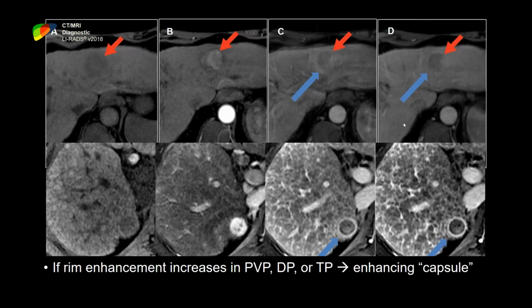Ultrasound would not be detecting the corona, so most likely the ultrasound size of this lesion would be the size of this lesion on one of the images that does not show the corona. But that's my speculation.